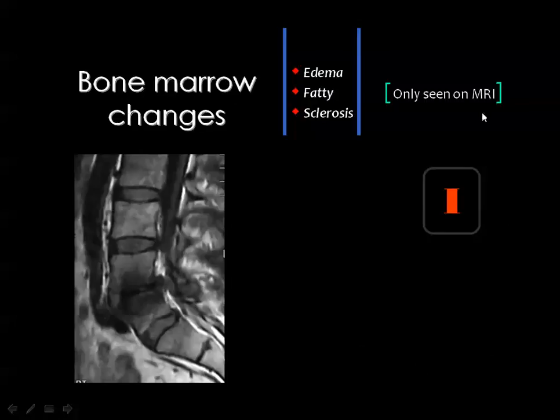And you know that MRI is one of the best ways to assess bone marrow abnormalities. Plain X-ray and CT are not able to see the bone marrow, but MRI is good for this particular issue. Usually, when the disc degenerates, it loses its water content, then it loses its height, then it develops air inside the disc substance, which is known as vacuum phenomenon. These changes may be associated with abnormalities in the bone marrow of the vertebra above and the vertebra below.